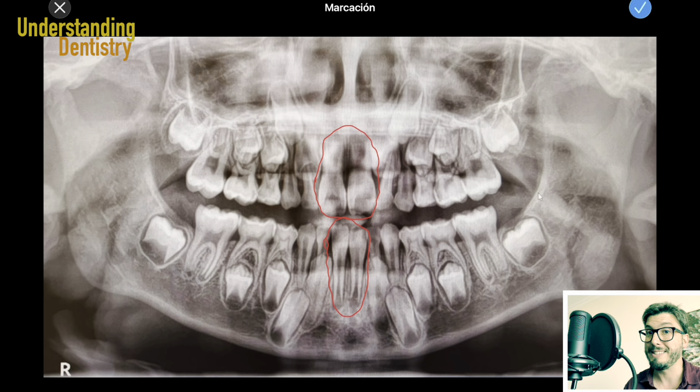That's why you are not seeing the deciduous central incisors. Otherwise, they would be on top of these ones. So very clear aspect, very easy to remember. The apices are still open even though they are erupted because the apices will take longer to form, to close. Okay, so that's also a very easy aspect.